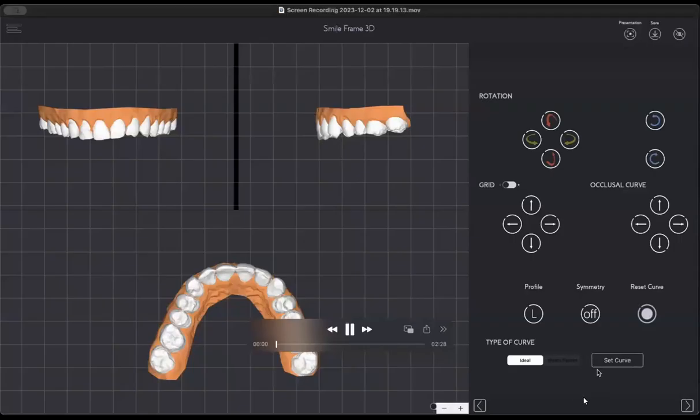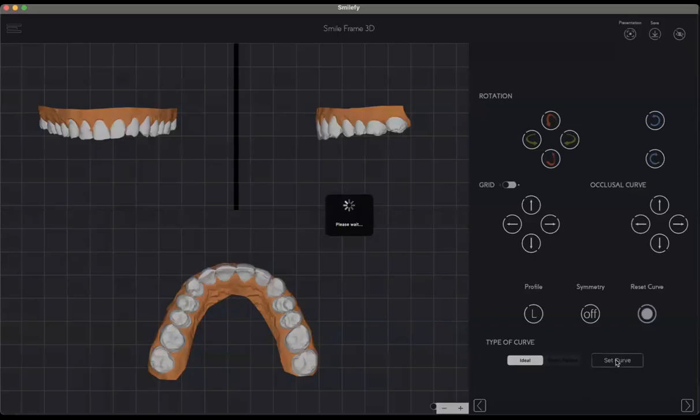And everything that I show you is the first version, right? The first version of our technology. My vision is to push the limits of technology, push the limits of everything, and to create something so new that it's going to bring us to a complete new mindset when it comes to smile designs. Another case, you see profile, frontal, occlusal view.